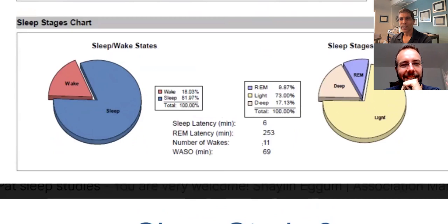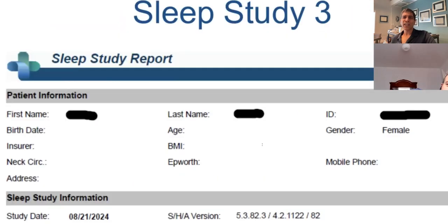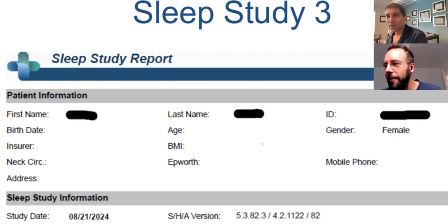WatchPAT number 3, are we ready? Let's do it. Are you learning a lot, Andrew, through this or no? I'm learning a few little things, but I know most of it. You know most of it? I did a good WatchPAT video. I don't know if you watched that. I did not. But do you think the audience would learn a lot from this then? Yeah, I do, especially because it's coming from you. Oh, I see.